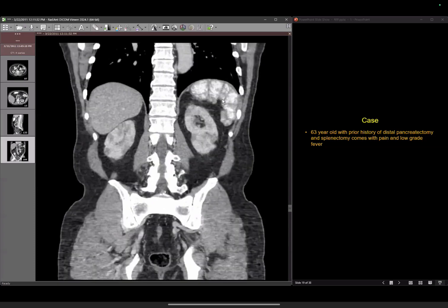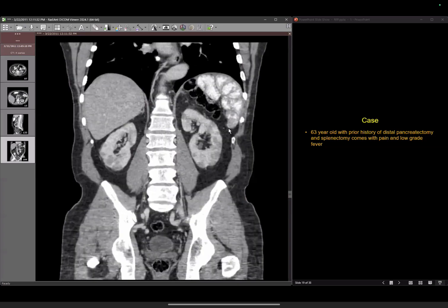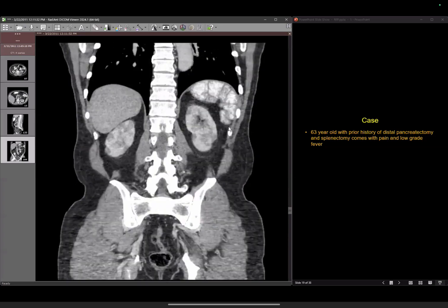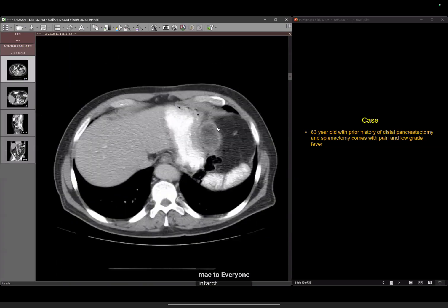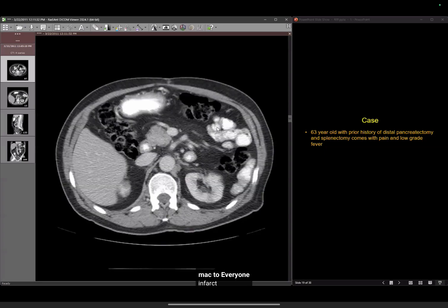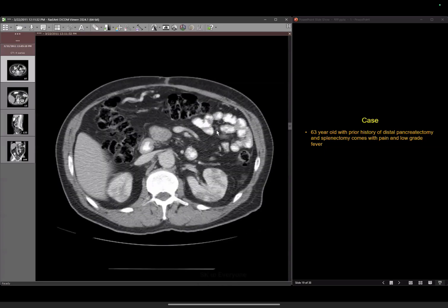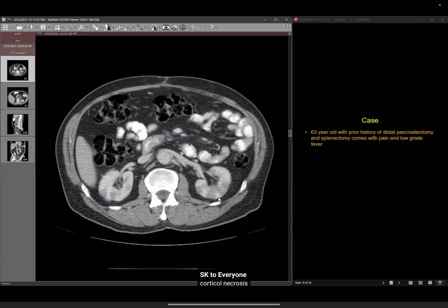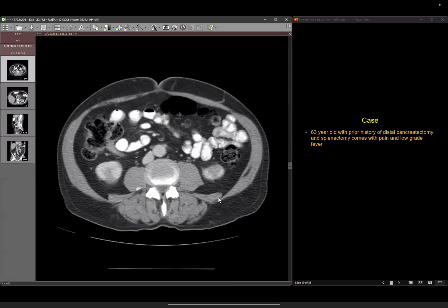So let's think about that. If you think about multifocal infection, do you see a lot of stranding of the fat, perinephric fat? Yes, sir. But here it is absent, so less likely to be an infection. Good, excellent. So renal infarction. Yeah, so renal infarction, again, those are typically more wedge-shaped and low density and multifocal infarcts like this, meaning the patient is showering multiple emboli.